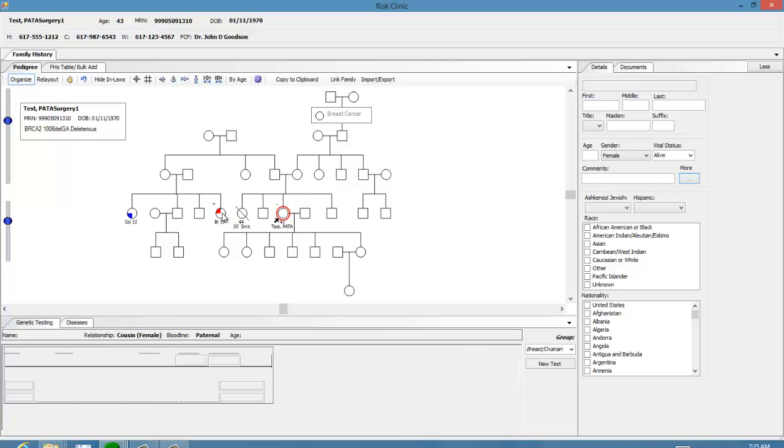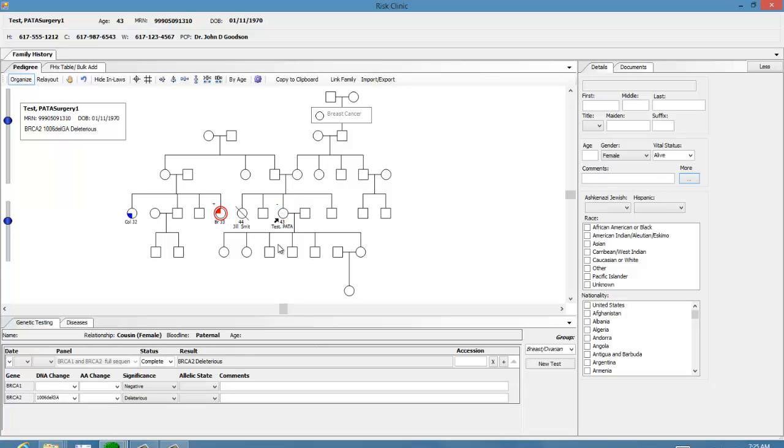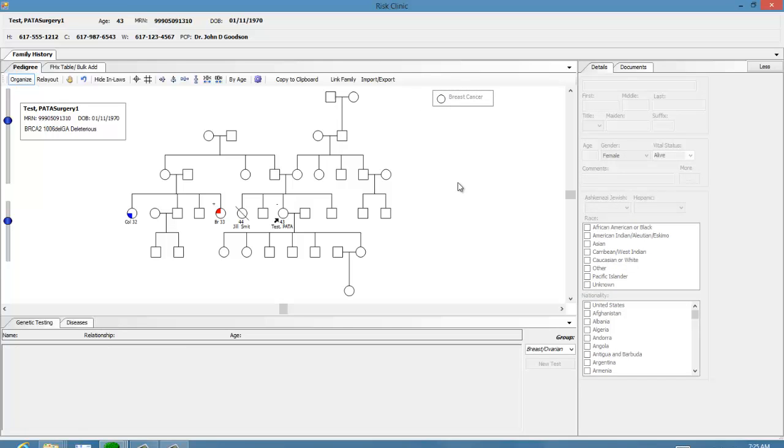Let's go over here again and look at this individual patient. And now suppose that you want to produce a slide of this family. Well, with this family, you may not wish to show the names of the individuals. You may want to move the legend out of the way on the individual as well.